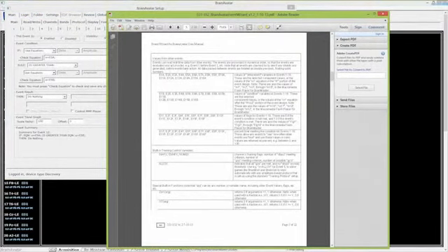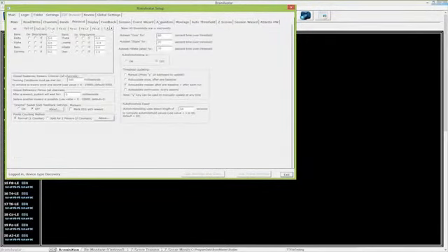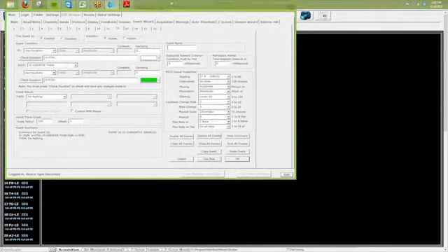Well, we see all of our A commands here says the value of the antecedent variables in events 1 through 16. Big word to basically say the original if portion, or as I defined it earlier, my band. All right, so this portion right here, E5A, is looking right here at E6F. If that number, whatever that is, it's just going to display that number as it is. So if it's 1, then it's going to display a 1. If it's a 0, it's going to display a 0 right here.